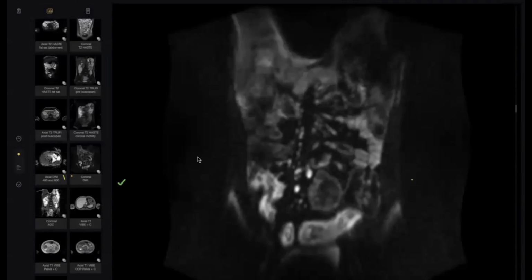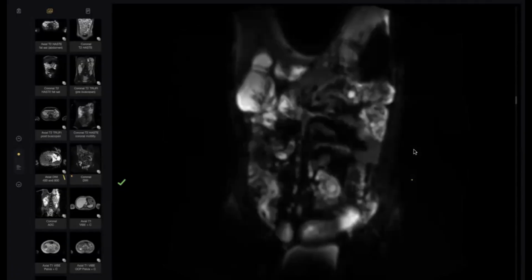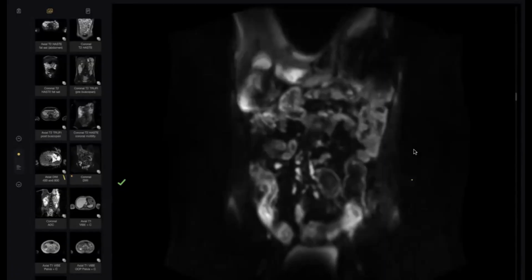What do you think? On ADC imaging, I think there is... Not ADC. Why? Look at the fluid. This is DWI imaging, in which there is restriction. Yes, there is restriction noted in the previously mentioned ileal region. So I think this restricted diffusion shows that this is active inflammation.